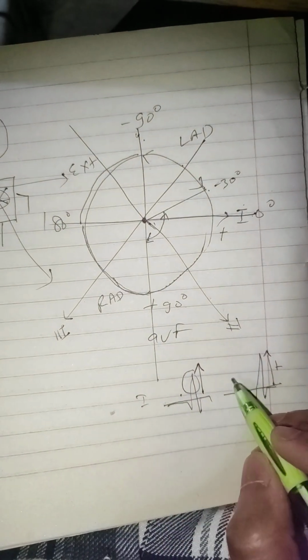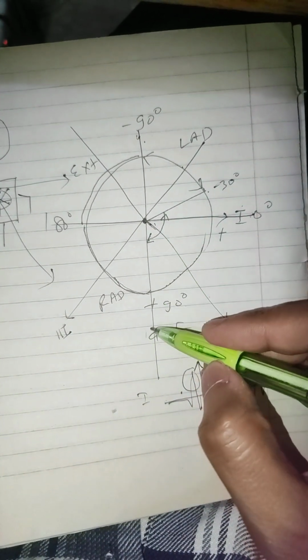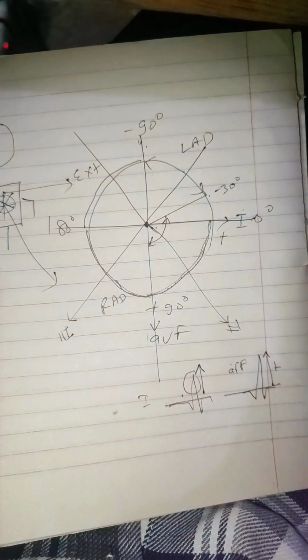So from this baseline the majority of the amplitude is positive. So if lead 1 is positive and AVF is positive, it means that the axis is falling between this range, right? So this is normal axis.